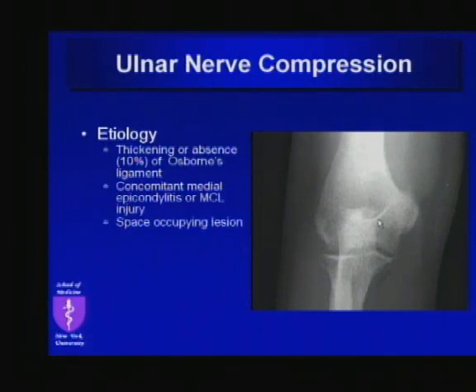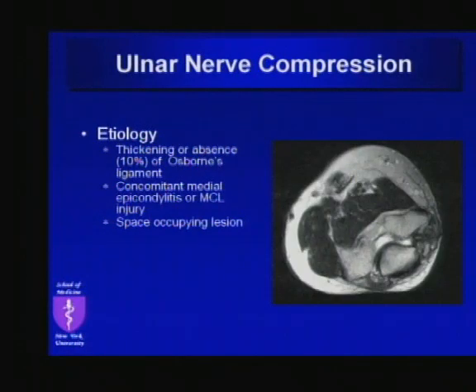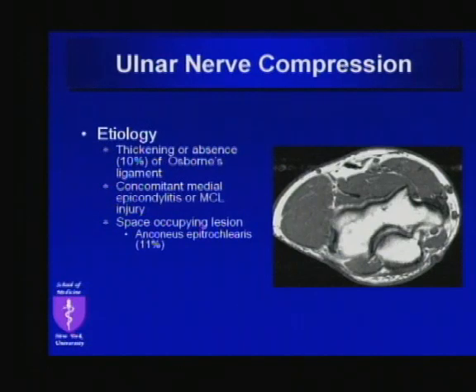And we'll look at this case here on the right. You see this kind of fuzzy amorphous calcification here seen posteriorly in the lateral image. This patient was a polytrauma patient. When we did the MR imaging, you see this heterogeneous globular signal intensity filling the cubital tunnel. There's no space there for the ulnar nerve. And if you look a little more distally, look how enlarged and edematous that ulnar nerve is. So this was compressive neuropathy from heterotopic ossification in the cubital tunnel.